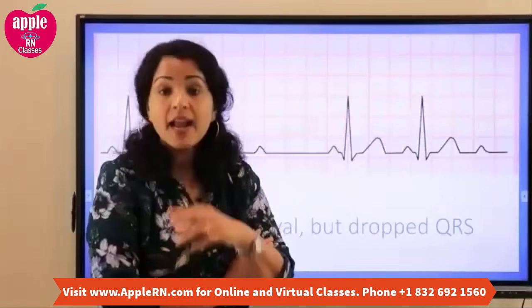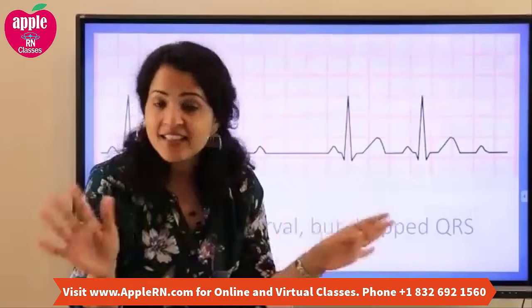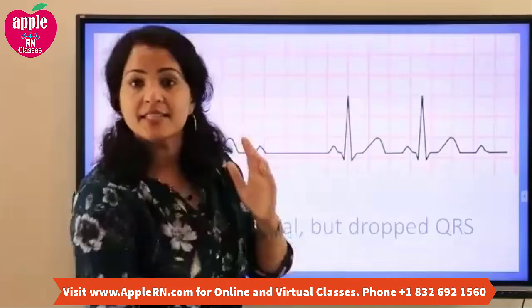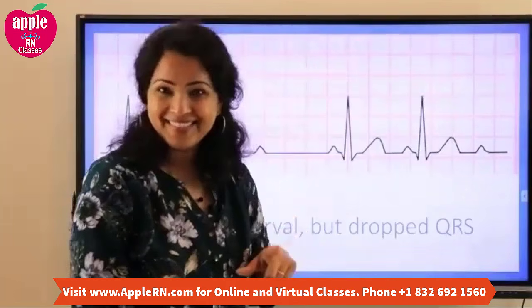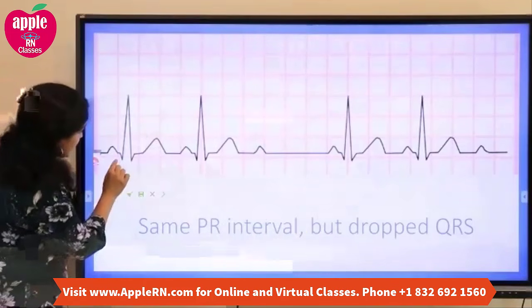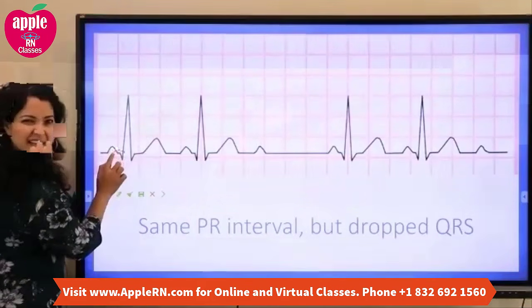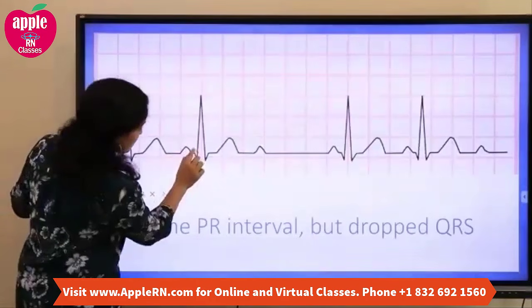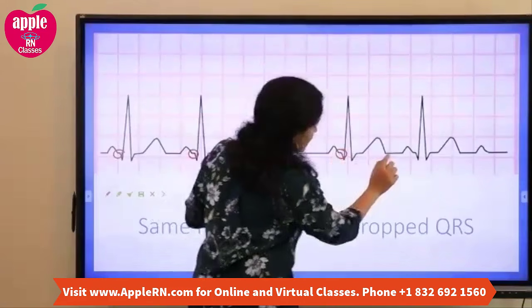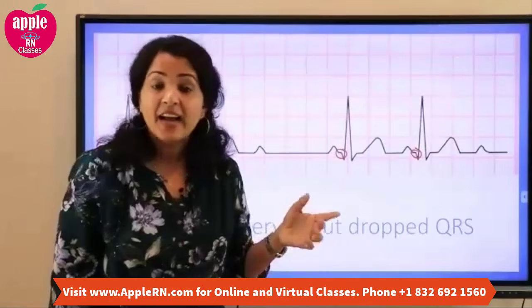But here in second degree type 2, there is no sign. There is no PR interval getting longer. The PR interval is correct, but he just didn't come the next day. That's it. Okay. So what this means is, if you look at the PR interval, it's not really easy to see, but still there is a PR interval here, there's a PR interval here, there's a PR interval here, and here. If you look at the PR interval, it's all normal.